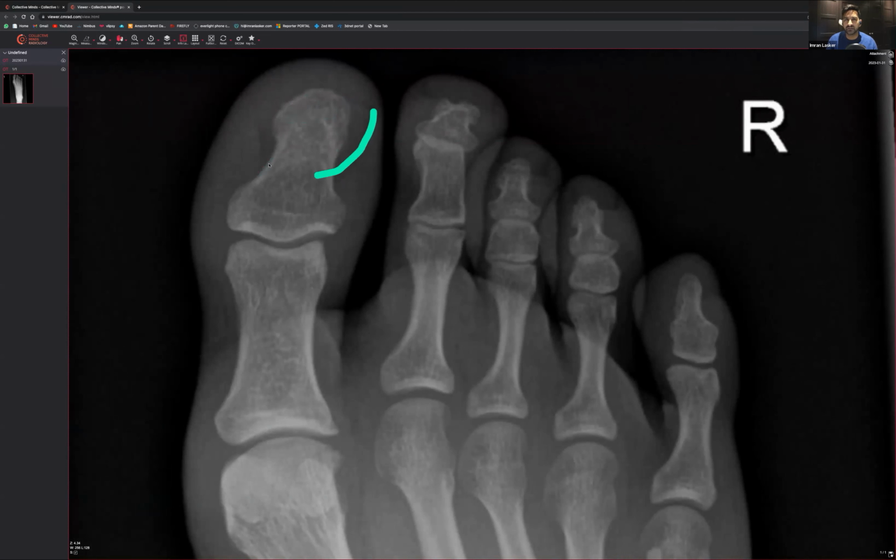Make sure you've had a good look at that nail bed. Make sure that's not mistaken for a fracture. That nail bed's going across like that, so any line along there you may think is a fracture, have a look again. Terminal tufts, terminal tufts, terminal tufts. Has anyone seen anything so far? Go along like this. No, I haven't seen anything.